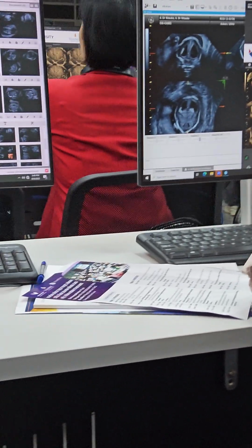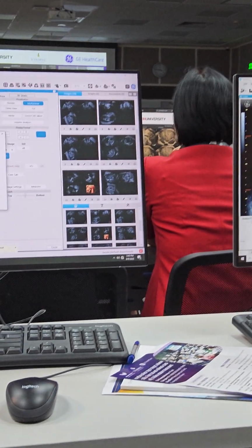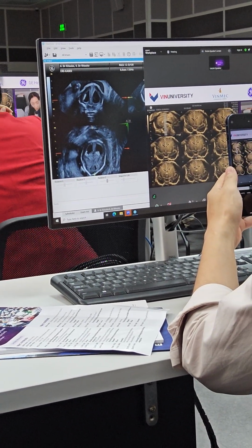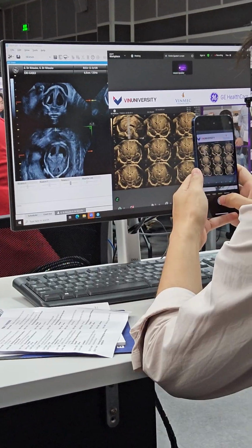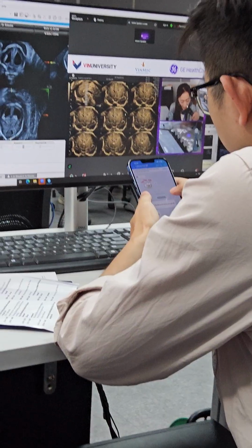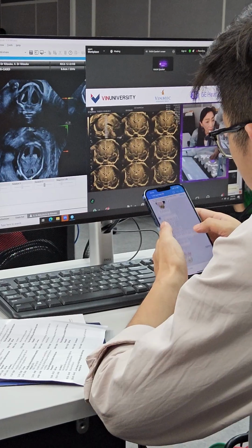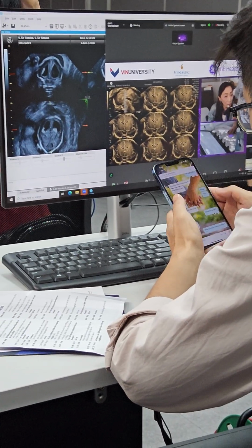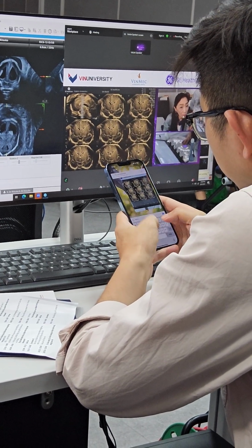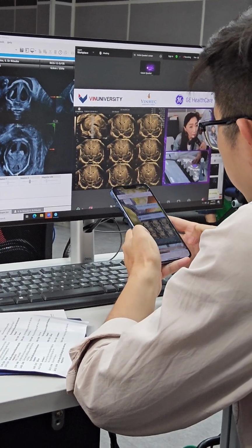Okay, so I think this is, at first glance, I thought this is almost normal, right? But the ultrasound eye is completely correct. I think this is not only abnormal, this is a small thing, right? This is a very subtle thing. However, from this subtle CSP shape, you see the thick septum on the right-hand side, and the bigger one.